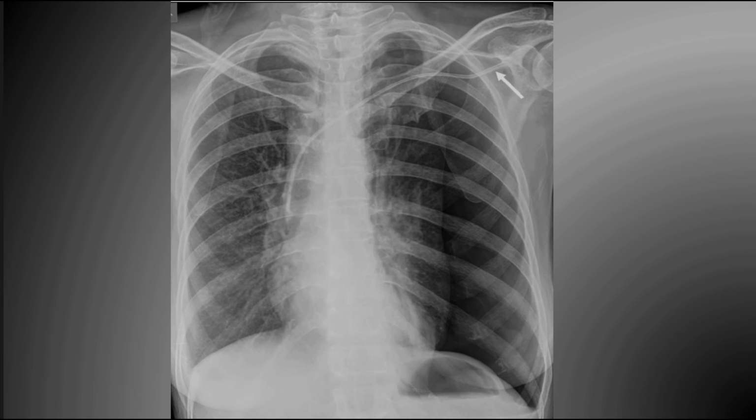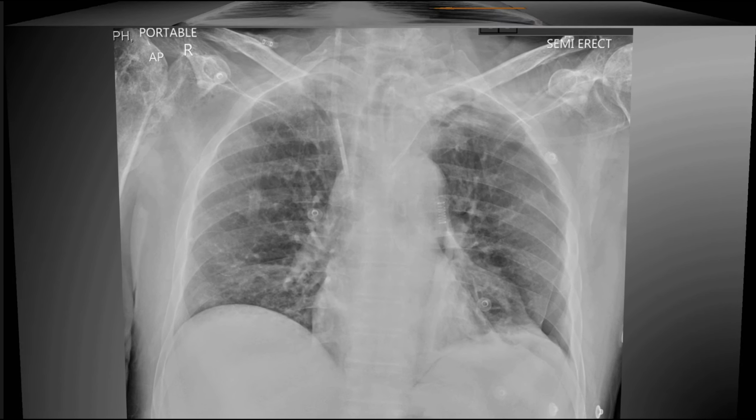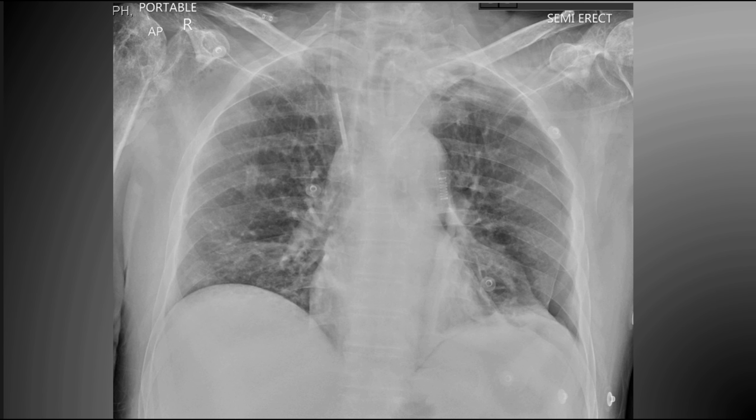I showed you this picture earlier, a pneumothorax associated with a central line. You've just put this central line into your patient. It's a right-sided internal jugular line, and you've carefully evaluated the right lung for pneumothorax, and you're very happy with yourself. However, make sure that you don't miss the pneumothorax on the other side. That was entirely coincidental.